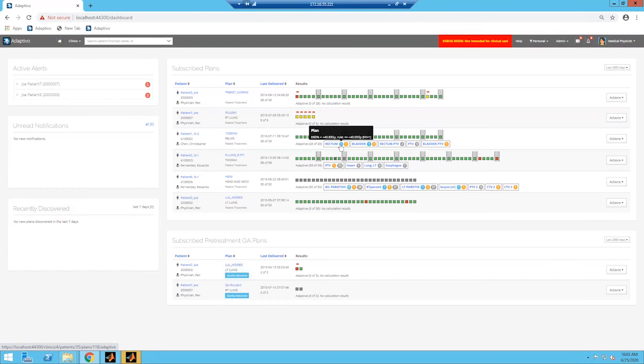So for this particular ROI, the rectum, the rule is that 60% of the volume should receive less than or equal to 40 gray. The rule is broken very slightly in that the actual value of the rectum D60% is at 40.93 gray. So the user can assess this, discuss with the physician. The physician may be well aware, it could have been something that slid through the cracks. There are quite a few ROIs in many plans these days, so it's just a nice quick QA tool to verify that the planning criteria are met for each plan.